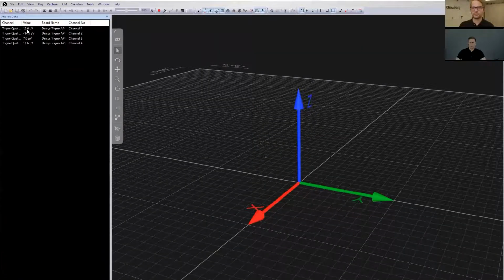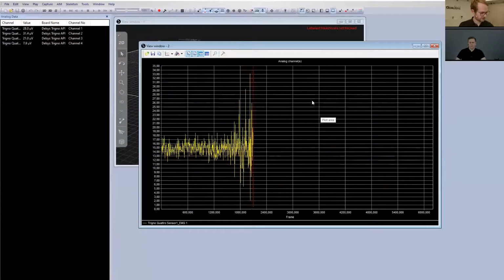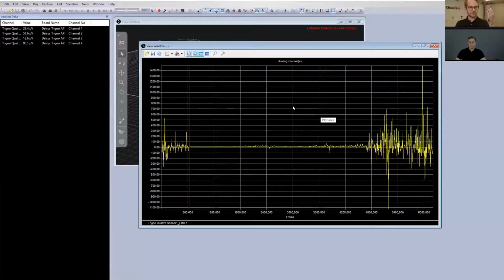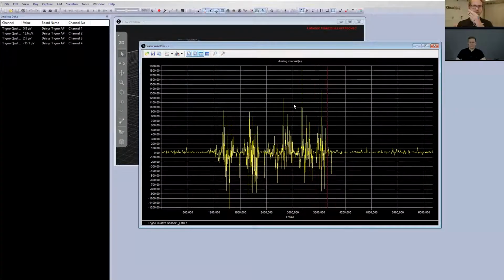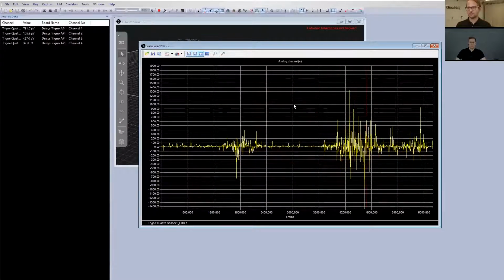So what I can do now, I could say maybe I want to plot the first channel, which is basically a channel that is adductor for the fingers. It's the one that is located right here, the blue one, which is basically a hand muscle that is activated when I'm pressing the fingers together. And I can see the signal coming up here.